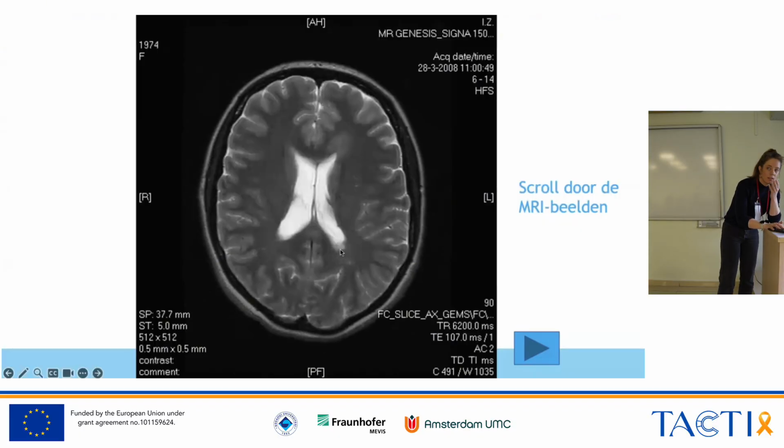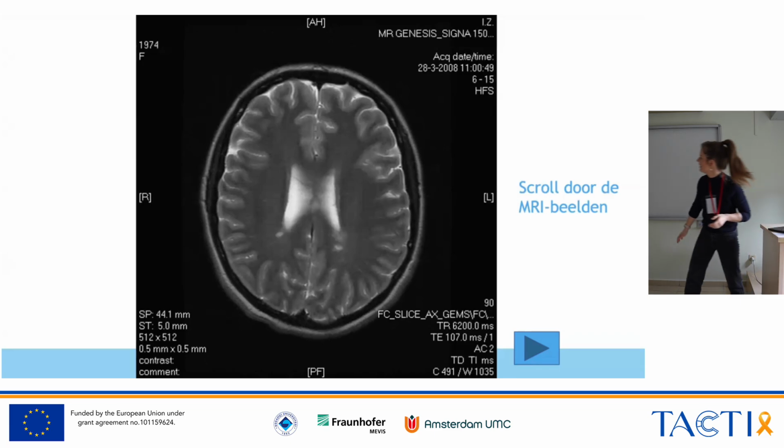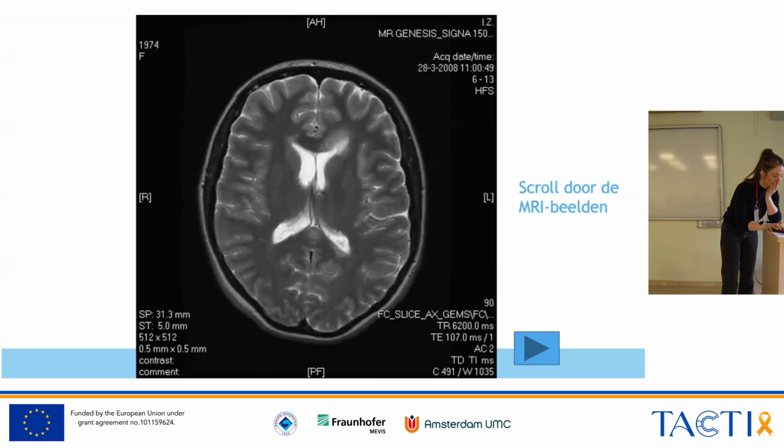Do you want me to make it darker for a second? Yeah, we could perhaps, if that's not too dark. Yeah, people don't fall asleep. There's never too dark. There is a too dark. Do you see the stripes a little bit better here? Yeah, so this is one here. And this could be the veins, yeah. And this one? Yeah. Here? The most prominent one, I think here as well. This is also not normal if you compare this area to this area.